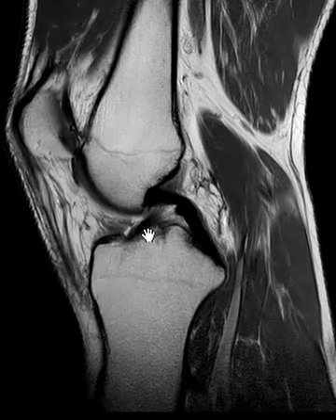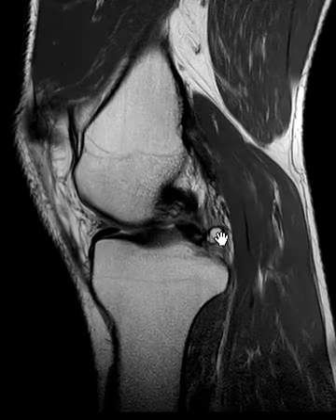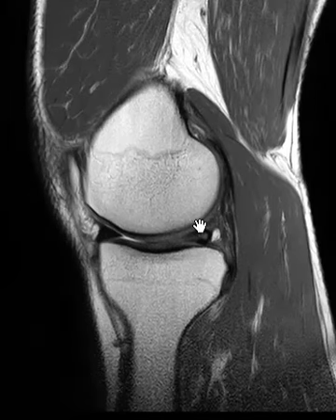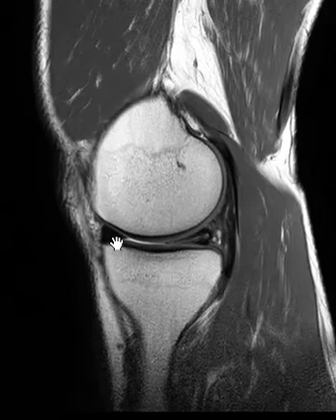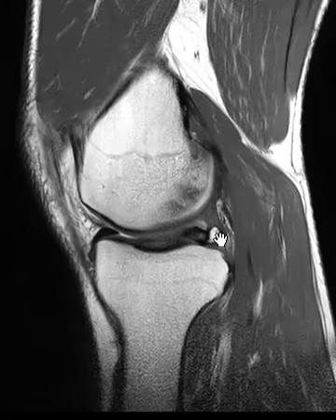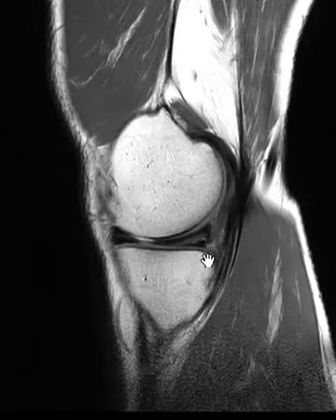If we go off towards the medial side, we see something behind the meniscus. There's a little funny fluid collection here, a little cyst behind the meniscus. The meniscus is this little dark triangle, and we can see that the back of the meniscus, the posterior horn, is not normal. The front is a nice, beautiful, dark black triangle. The back, though, has this horizontal band of brightness within it, and there's a little fluid collection behind it. And so this is a meniscal cyst and a parameniscal cyst.